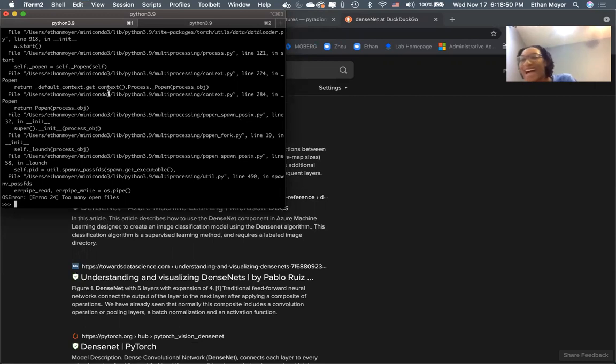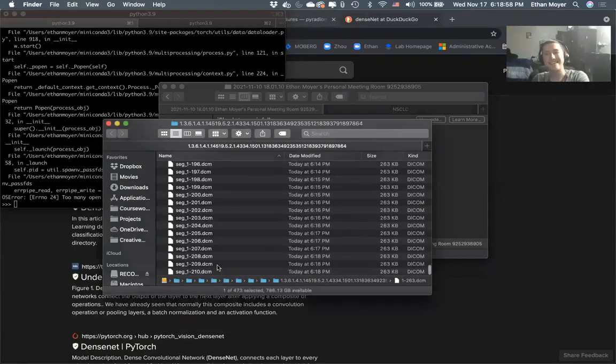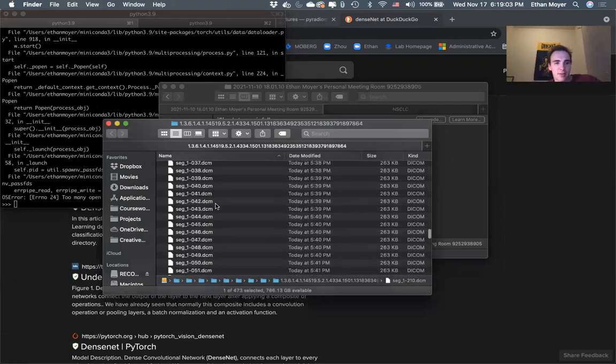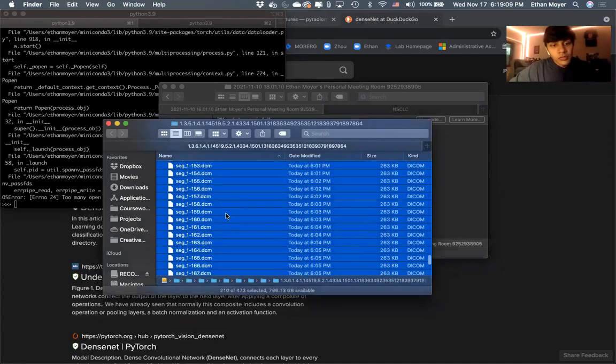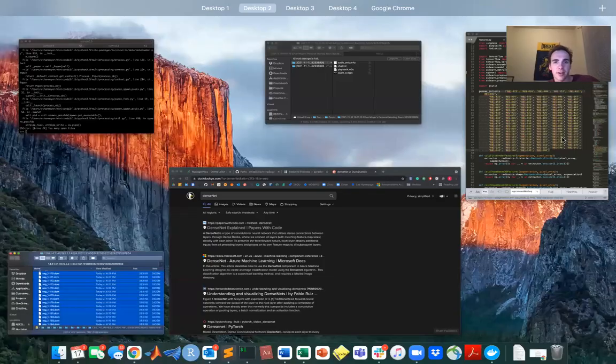See what happened. Too many files are open. I wasn't joking, it stops after about 200. I don't know how to fix that. Wait, it stops after 210 files. If I try opening another file, it fails, so it's not closing a file somewhere. I don't know why.